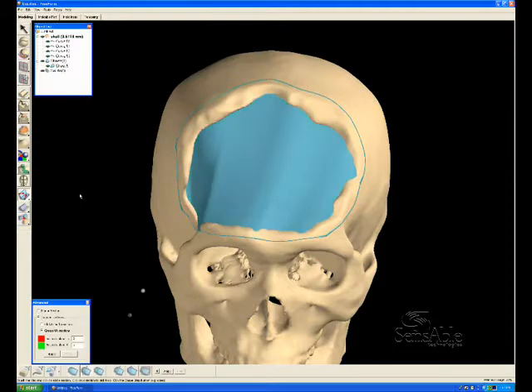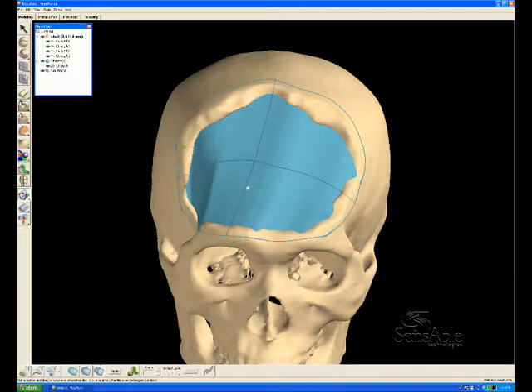We can use the shape patch command to establish cross-sections for this simple NURB surface. Let's establish one in the U direction and one in the V direction. These cross-sections have edit points assigned to them. Let's lower the number of edit points to 3, therefore simplifying the number of edit points that need to be moved to describe the complex curvature of this skull patch.